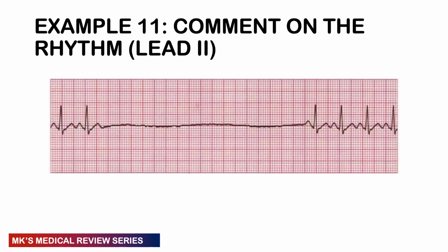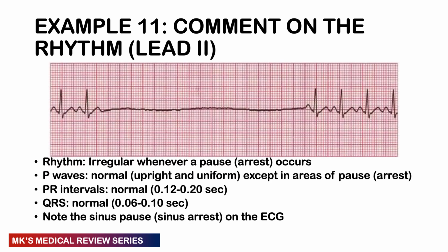Next example, this one is even more obvious. You may pause the video, and here comes the answer. So again, it's a bit regular when you look at here to here, here to here, here to here, but look at what's happening here. It's like this person has completely no activity, as if the activity of the sinus has been paused. So we call this a sinus pause or a sinus arrest.